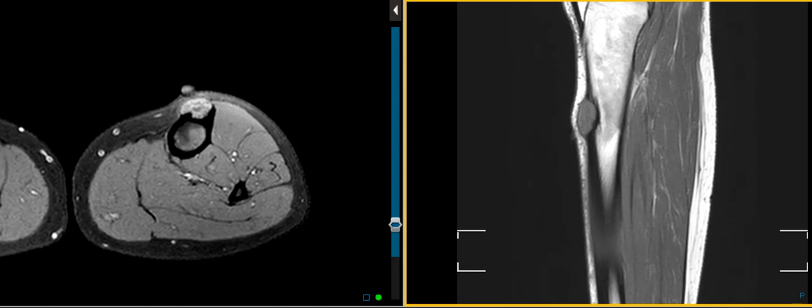Also, anytime we see an expansile bone lesion with scalloping or erosion of the bone that comes off the surface, we can also think about an osteosarcoma, called surface osteosarcomas. There are several different varieties, but one of them is a parosteal osteosarcoma or a periosteal osteosarcoma, and they are usually more irregular, more lobulated. On the X-ray or CT, we'll see much more bone density. This is more uniform, and it looks like a chondroid matrix, and it's very sharply defined. So the smooth margins argue against that. Plus on the X-ray, it didn't have really wild bone density that we might see with an osteosarcoma.